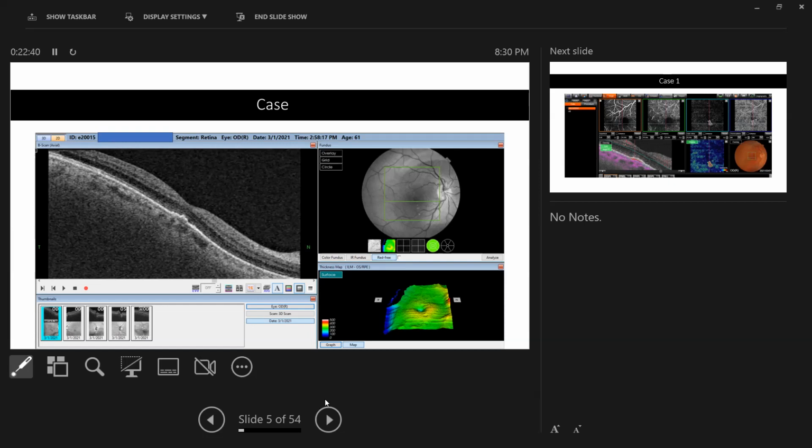The vascularized drusen means on the OCT angio there is a high flow over the areas of the drusen, so you need to pay attention, because at any time these drusen may be converted into macular neovascularization. That's why, in my opinion, I am using the Triton machine. I have access to OCT and OCTA at the same time for my patient, so I look into all modalities and make my assessment, a multimodal imaging approach.